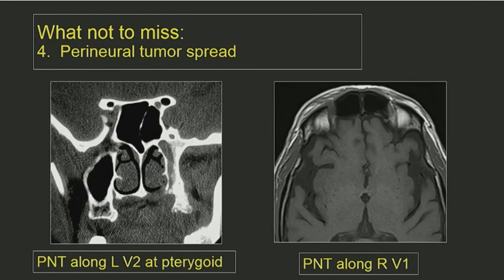Every sinus and every face CT has so many neural foramina that it's just so critical to be looking at these and not just the maxillary sinus mucosal cysts or polyps. This was called normal sinus. You can see back here there's a normal palatine foramen at the back of the palate. Look at it here. The floor of the nasal cavity is destroyed, the greater palatine foramen is widened, and soft tissue is extending up the Vidian canal.